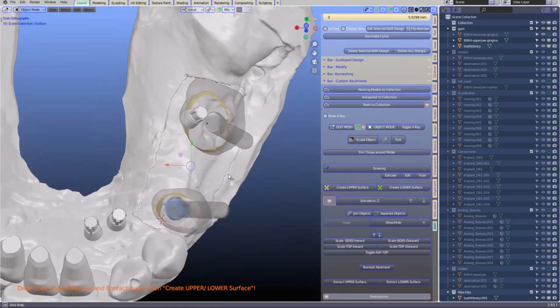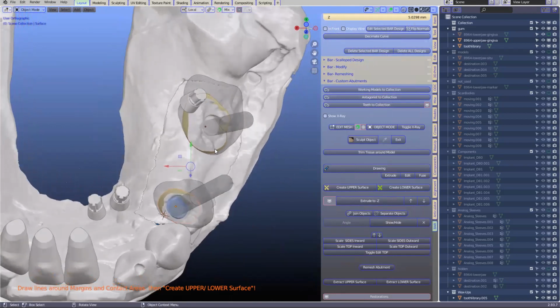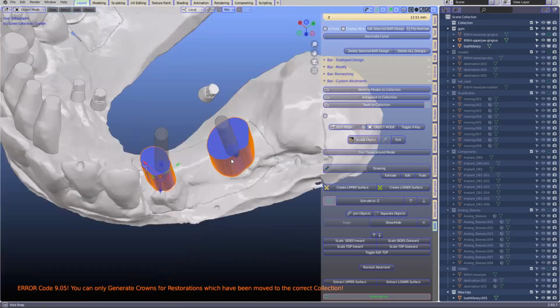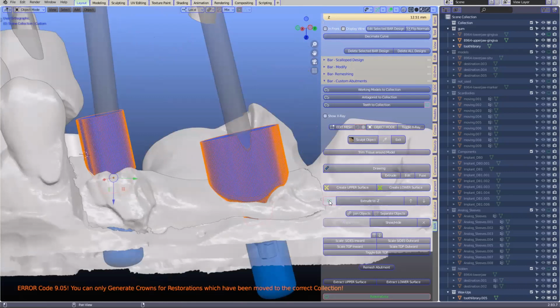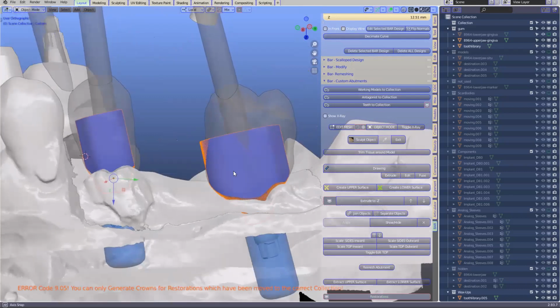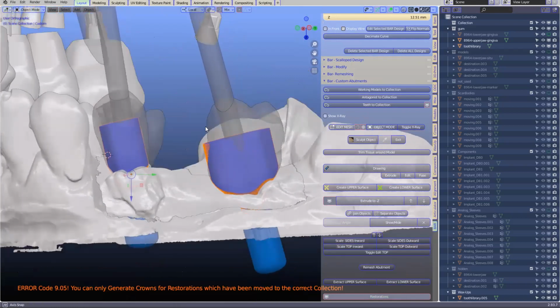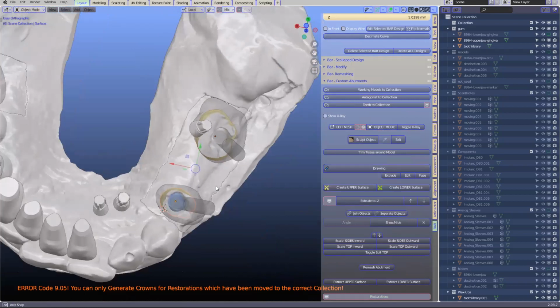Also, you don't want it to extrude into the contact either. Yeah, so equidistant, kind of. A bit of intuition is quite good, and practice, of course. Okay, extrude. All right, so we've got it extruded. Let's see where our crown is. The crown here is outside a little bit. We can change it, or you can go back if you want to. Okay, let's make this one back again. Maybe I'll just extrude it a little bit.